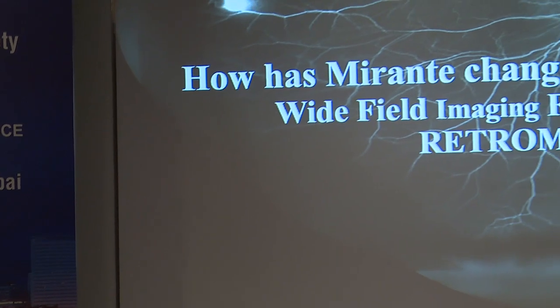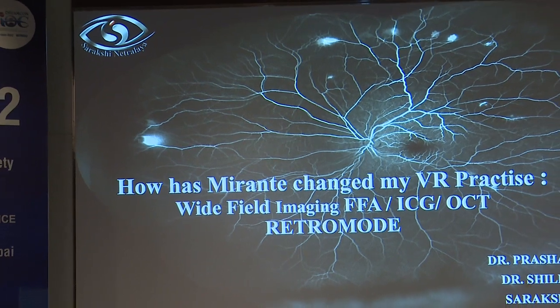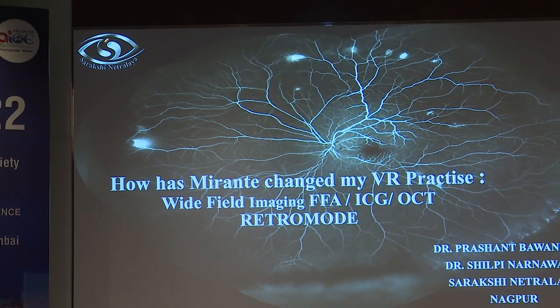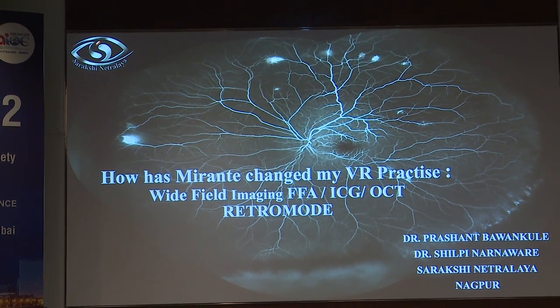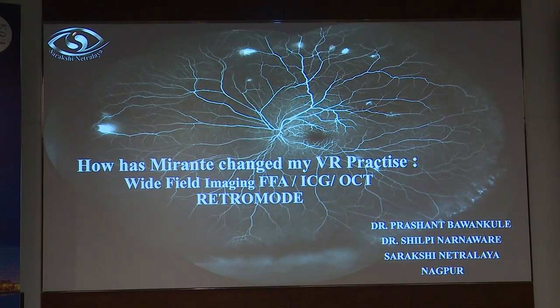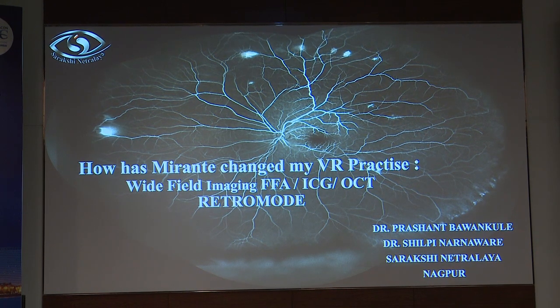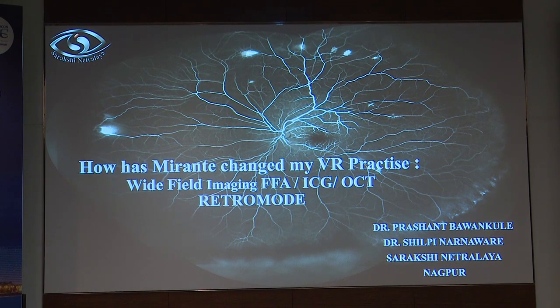Here I will be presenting a new technology that is a wide field, ultra wide field angiography and imaging system. This is a multimodal imaging system. This is the advantage. We get not true colored images, but the advantage over other systems is that here they use 3 lasers, unlike Daytona or any other systems available, and therefore it's quite closer to true natural images.